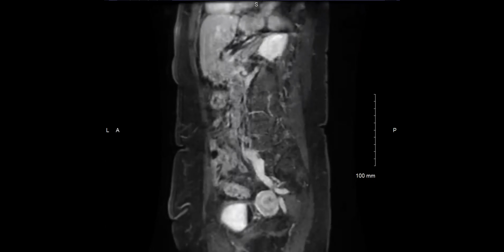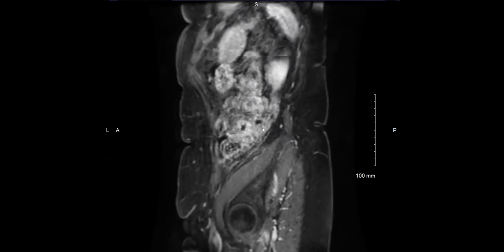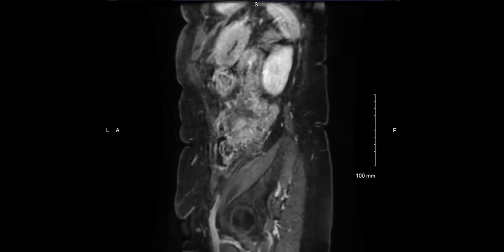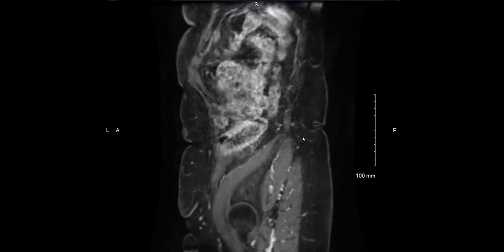So you can see here, right there, the thickened diverticulum with some inflammatory changes surrounding. So this was an incidentally noted diverticulitis. Patient was asymptomatic? The patient actually, when we called, had a little bit of pain, but didn't think much of it.